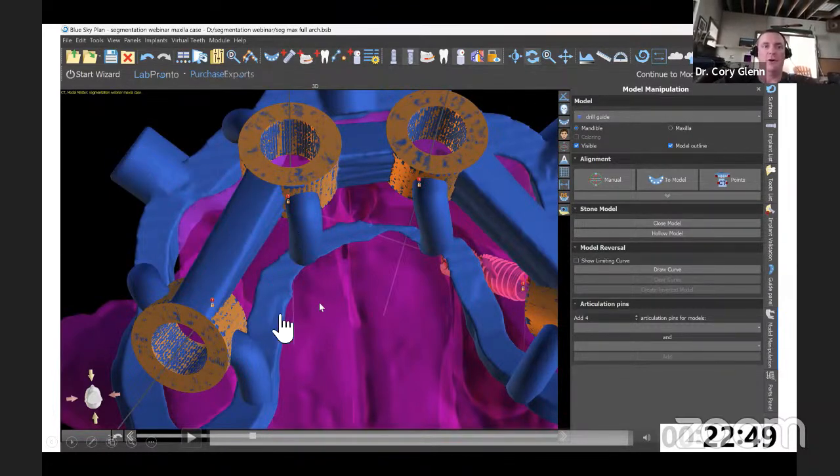So your pins are going to go into the same spot. If you insert this and you can't get your pin to go in, what does that tell you? It tells you that you're not fully seated because it ought to fit the exact same. And so you need to readjust until your pins line up. When the pins go back in, now you've got a simple method to do a swappable guide case.